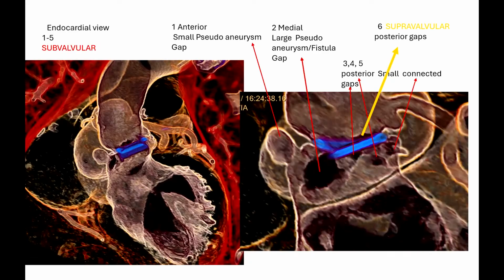Okay, and I have to show this case because it tells you a dramatic case of what CT can see, and in this case, I would say 3D really makes a difference. This patient came in with prosthetic valve dehiscence, huge paravalvular leak, pseudoaneurysm. They're asking us if there's any chance to do occlusion.